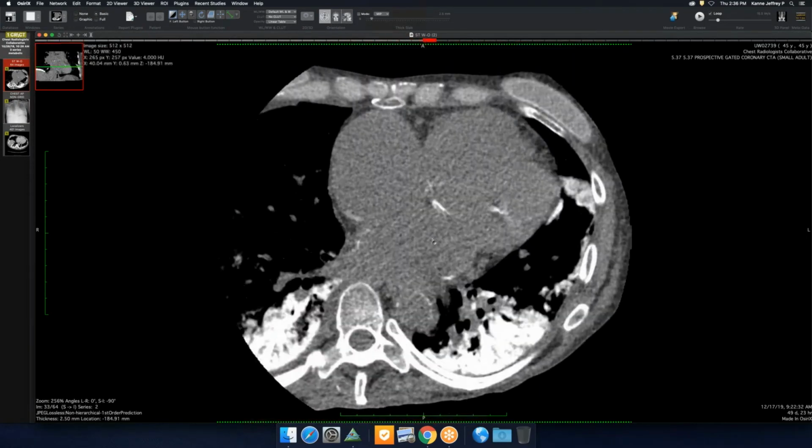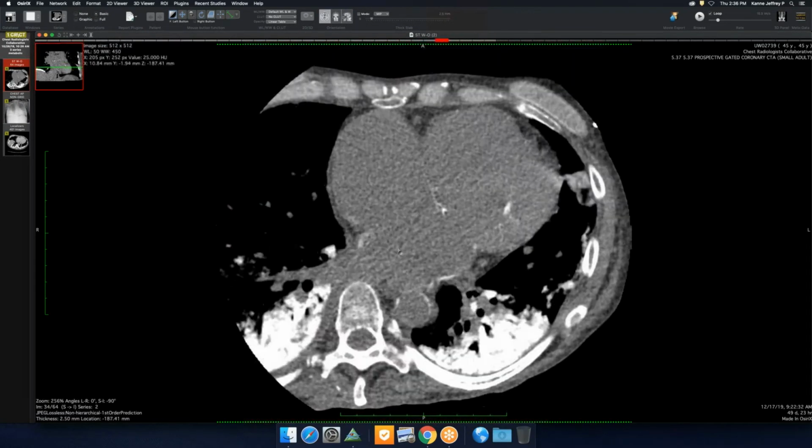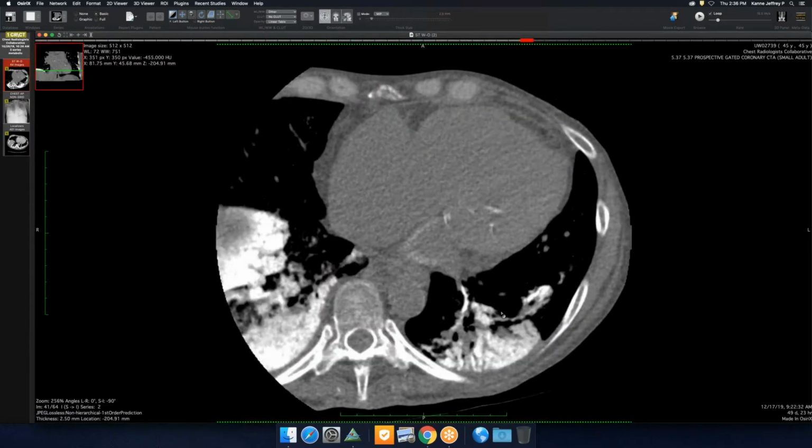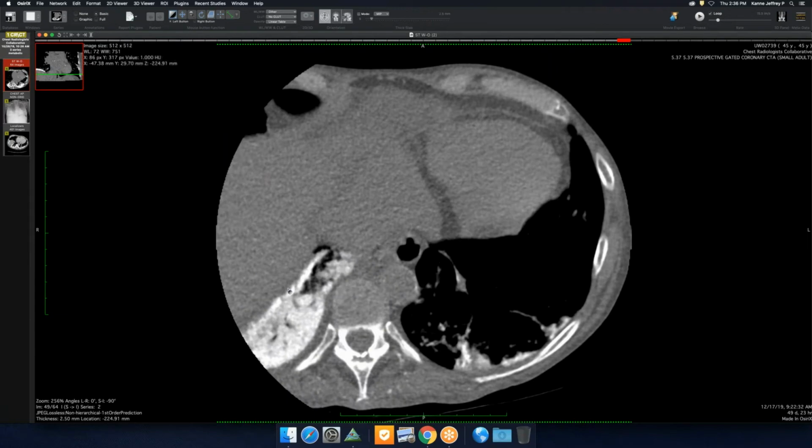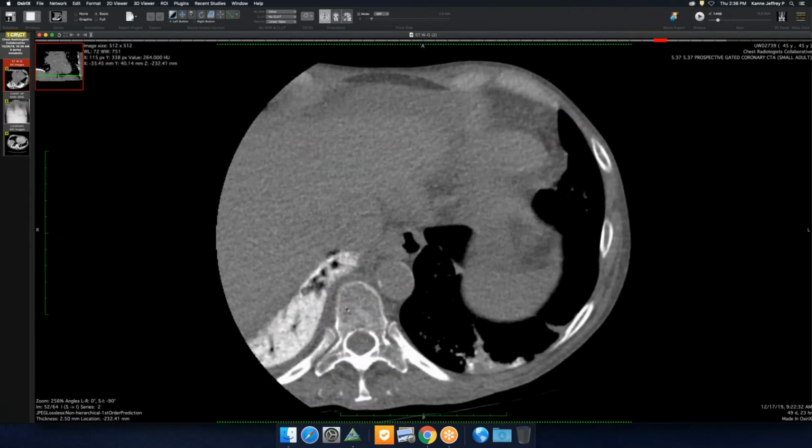We'll come to the lungs in a second. There's all this myocardial calcification, and then there's this exuberant calcification. This was actually a pseudoplaque on the diaphragm. It's actually just calcified lung.